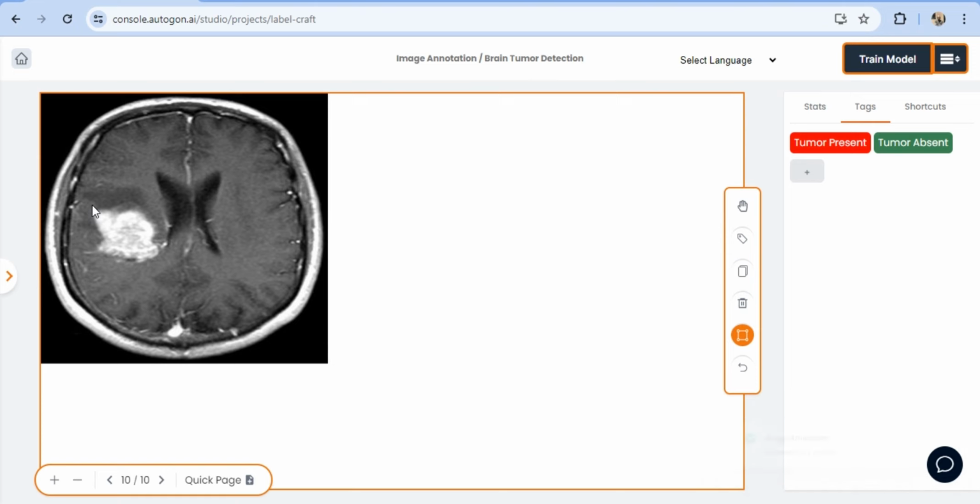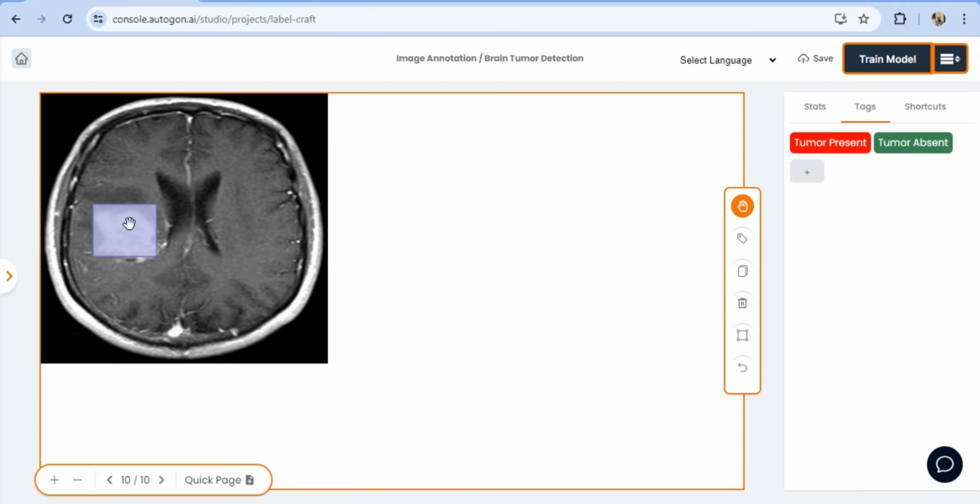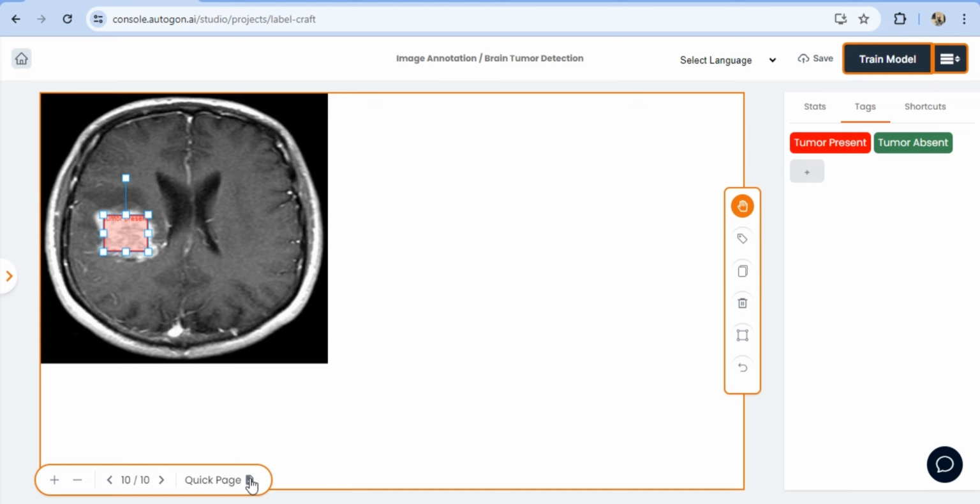So this is another very huge tumor as well. I think I might have picked a part of it where there isn't a tumor present. Okay. Now you see that I'm trying not to pick where those tumors are alongside where those tumors aren't. This is because I don't want to cause confusion for my model.